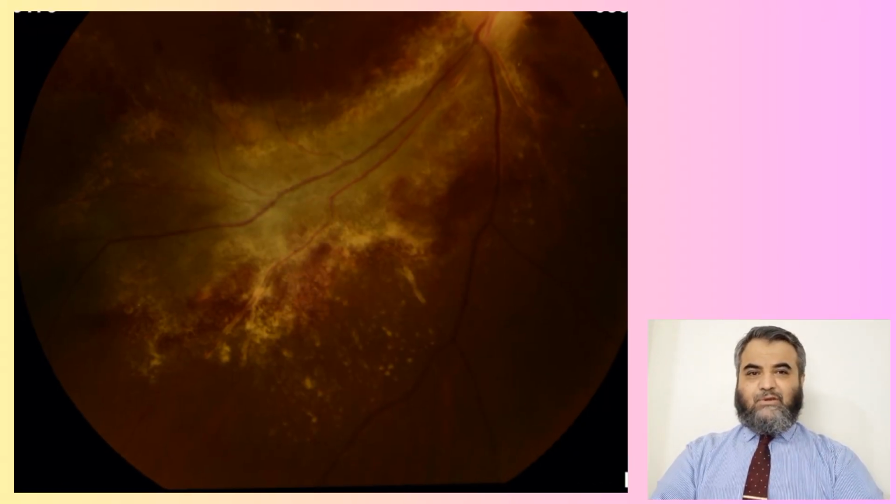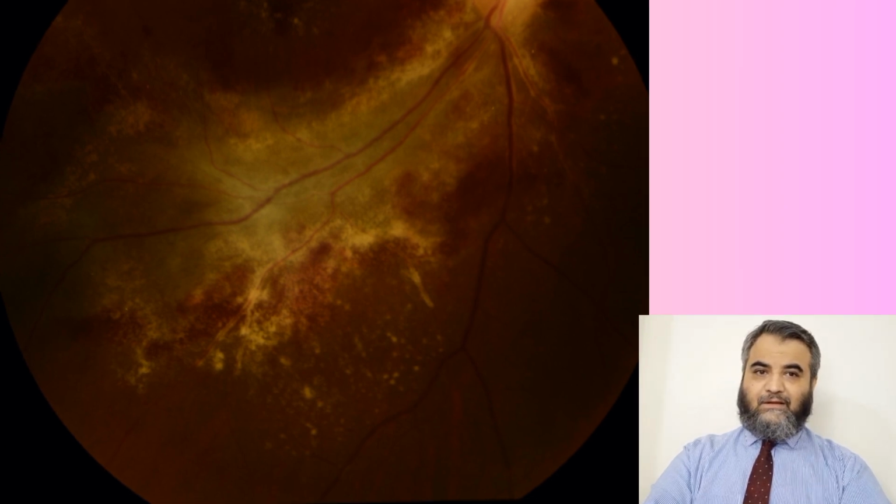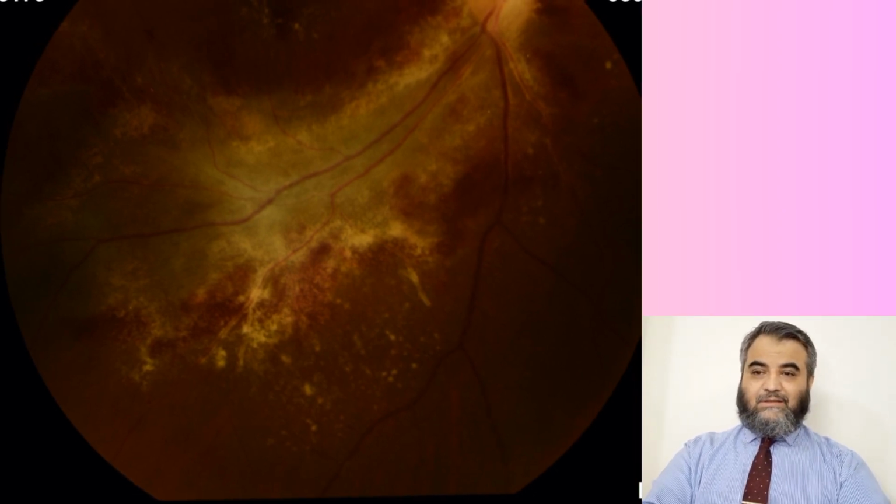This is the fundus photograph when these patients are treated with antiviral medication, which we will discuss later on. The lesion remains there, but it is no longer that active. It develops whitening, the retina becomes thin at those areas, the hemorrhages settle down, and later on they can develop holes. So these patients are very prone to retinal detachment. If not totally healed, the disease is settling down because of the antiviral treatment. It is no longer that inflamed, and the hemorrhages are also getting less.